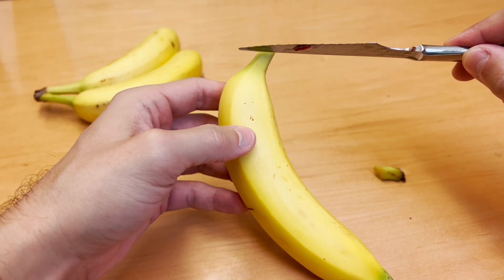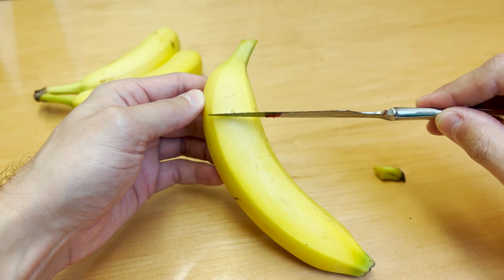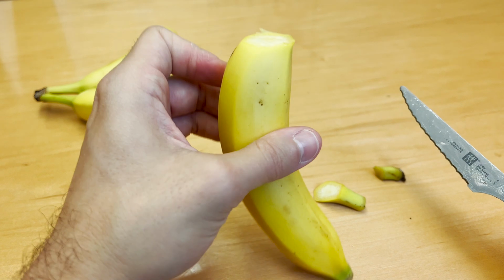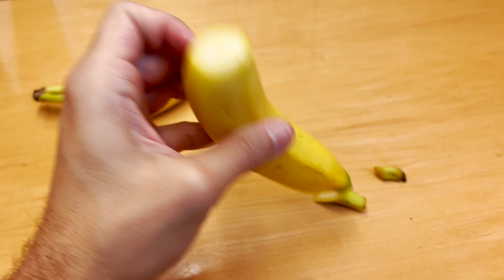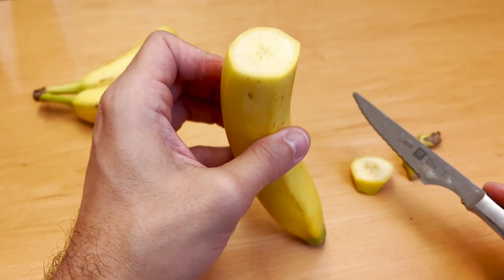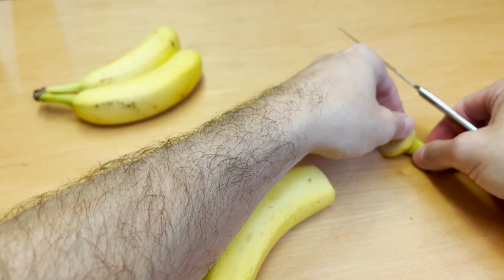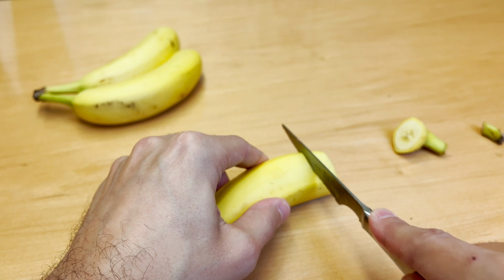But as we move our cut through, we'll see how the cross section of the image actually changes and becomes thicker or bigger as we move down the banana. So we'll go a little bit further down. You can see how that cross section changes there. If we move even further down, I'll try to make these cuts as parallel to the banana as possible. So that changes. Try to keep the banana kind of together. And then we're going to just keep working our way down.